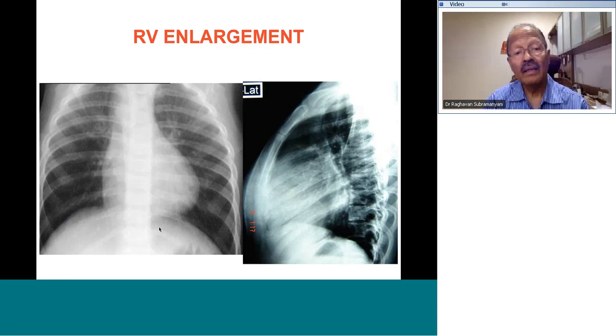Here we have a patient where the cardiothoracic ratio still appears to be normal. That is probably less than 60%. Therefore, it's difficult to diagnose any chamber hypertrophy. However, the contour is abnormal. See, the apex seems to be somewhat rounded, and something is making the apex sit up. It's pulled up from the diaphragm, and it's separated from the diaphragm. So something is holding the left ventricular apex up, and generally that's attributed to the right ventricle. This is called a right ventricular type of apex.